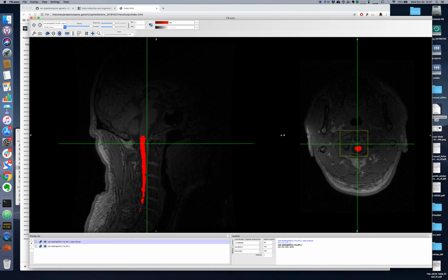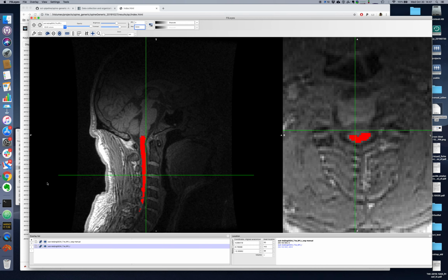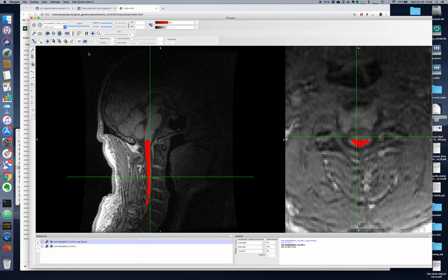So we can zoom in. Then we notice the under-segmentations here. So you can adjust the scale here. You can use Command F to toggle on/off the segmentation, which is quite convenient. On Linux, I think it's Control F. And then if you want to edit the segmentation, you need to select Tools, Edit Mode. And then you can change the size if you want.